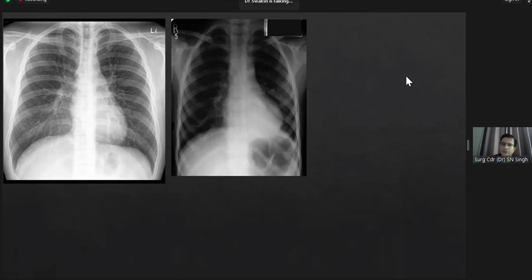You will rule out fluid. You will rule out calcification. Any air fluid levels? No, sir. You have gone into the diagnosis of what it is. That is why it is not coming to your mind. I would say it's a lung abscess. Just imagine, you have to think on those lines also. Obviously, it is a left lower lobe collapse, but I would say it's a lung abscess. In that case, air fluid levels, all those things also have to be just negative findings. You have to just rattle them off.